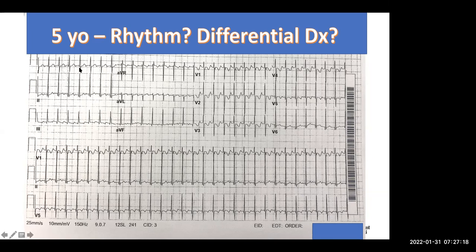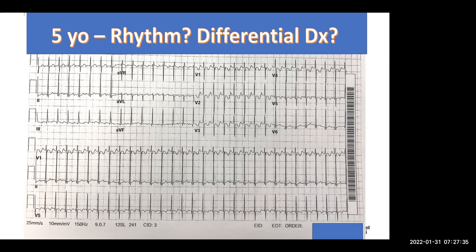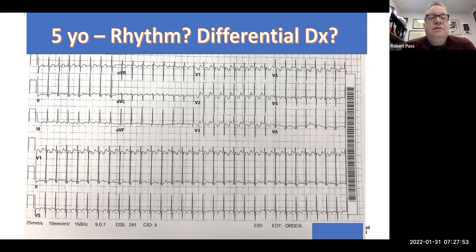It's almost more than one big box. It's almost one big box. So I would say 200 milliseconds. Right, so it's almost 200 milliseconds. Very long RP interval. So does ORT normally have an RP interval that's that long? I've seen close to, when we've been doing EP studies, like 150 milliseconds. Yeah, 200 is too long for that. 200's a little long, right?